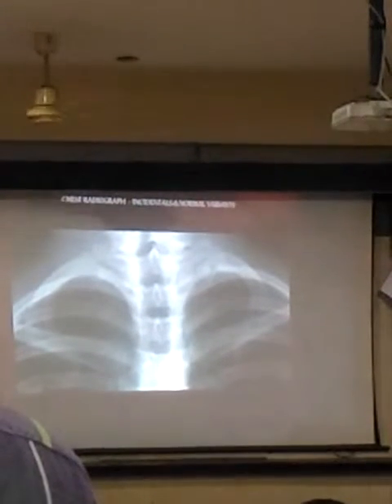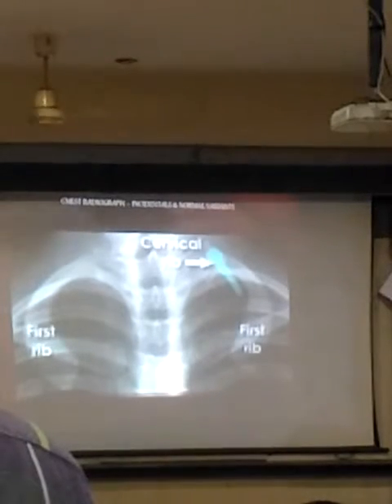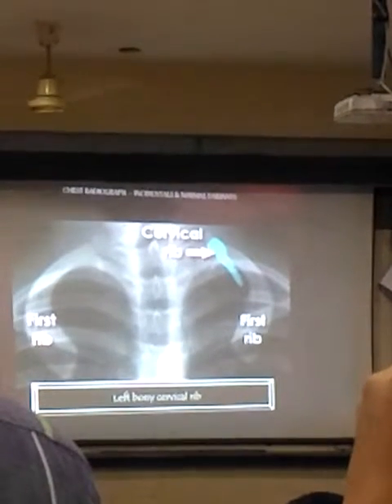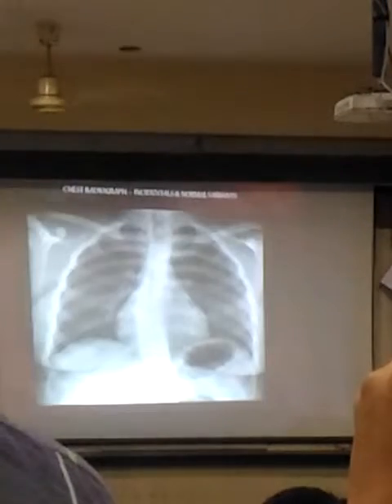Again, look at the ribs. Can you appreciate that? Again, a bony left cervical rib there. So this is how cervical ribs are. Okay? Again, an incidental finding.